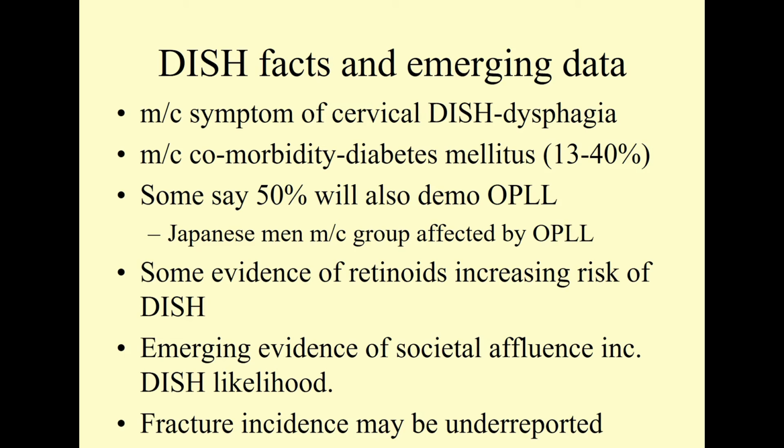But jumping ahead, we're going to be taking a look at, in the inflammatory group, something known as ankylosing spondylitis. That produces true syndesmophytes, and they're very thin joint margin bits of ossification, ossified outer annular ligament, actually. Well, they're very rigid. They live up to their name. So that very thin paravertebral ossification produces true fixation, immobility, and ankylosis. You've got this very thick and flowing ALL seen in DISH patients, which reduces range of motion, but not significantly.